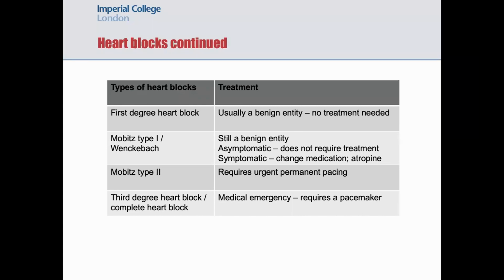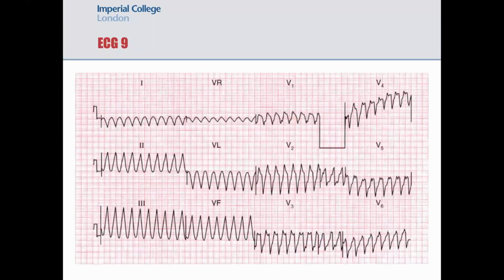So that's about heart blocks. We've only got 2 ECGs left. So again, just put down what you think this rhythm is.